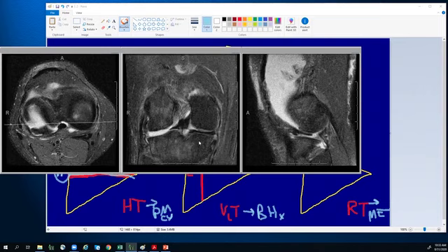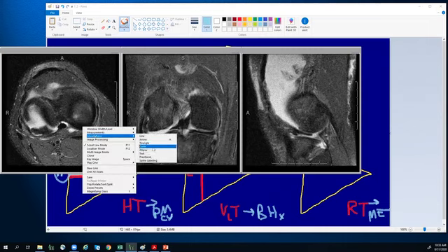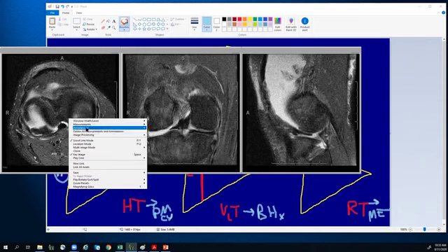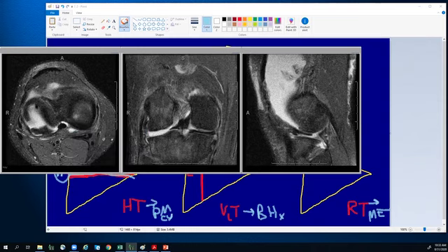And then you'll remember that the main complication of a radial tear is extrusion, meaning that we've lost the hoop stress, the meniscus is no longer really connected that well. So eventually these portions of the meniscus will be able to protrude from the joint because there isn't much other than the root attachments anchoring this into place anymore. So very commonly in people that have radial tears, they wind up losing a lot of cartilage on the side of the radial tear.